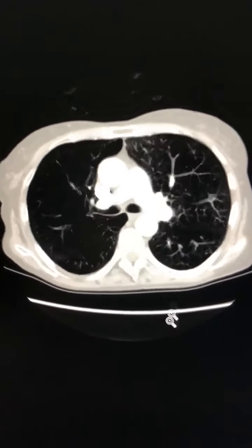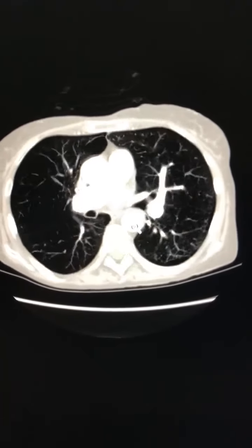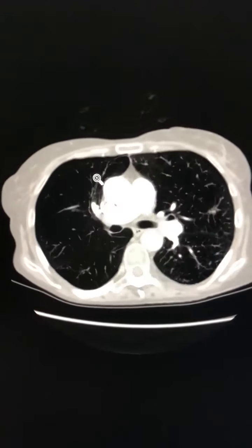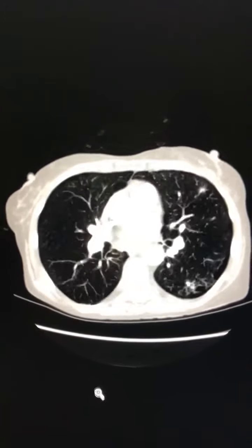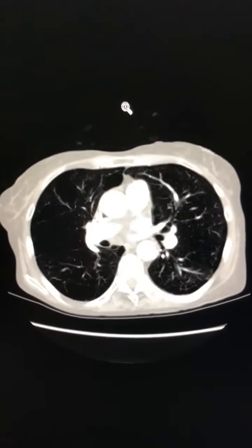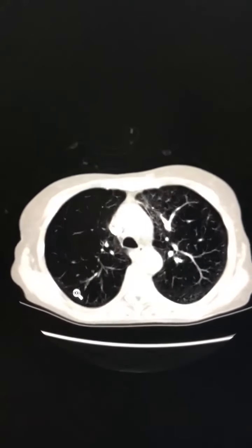So we will go down from the pulmonary trunk, and now we will follow the right lower lobe artery. We do not see any emboli in the right lower lobe artery. Then we will follow the right upper lobe artery, and we do not see anything in the right upper lobe artery as well. Then we will come back and we will see the left lower lobe artery. Left lower lobe has no emboli, and then we will go back to the pulmonary trunk and see the left upper lobe artery, and again there is no pulmonary emboli. So there is no filling defect.